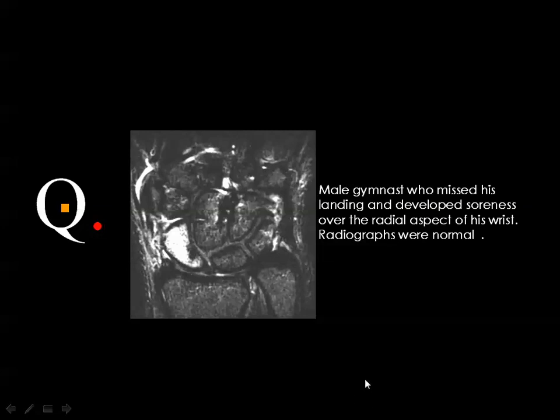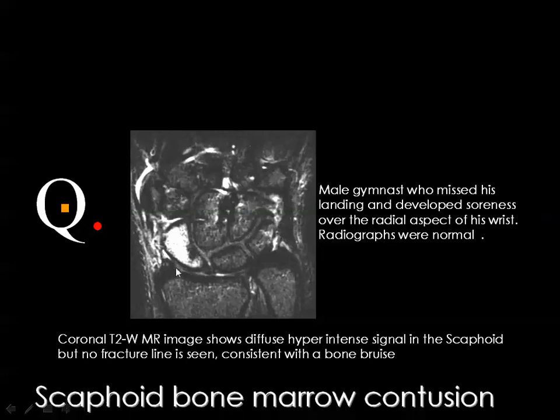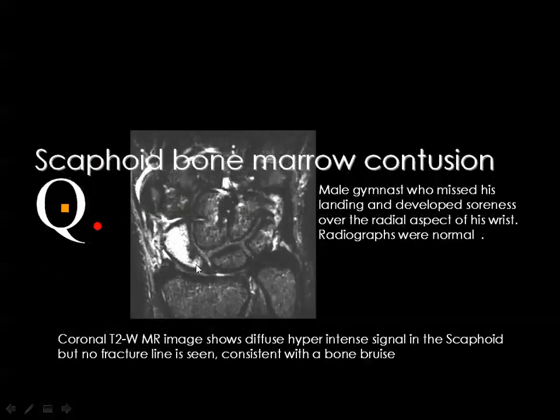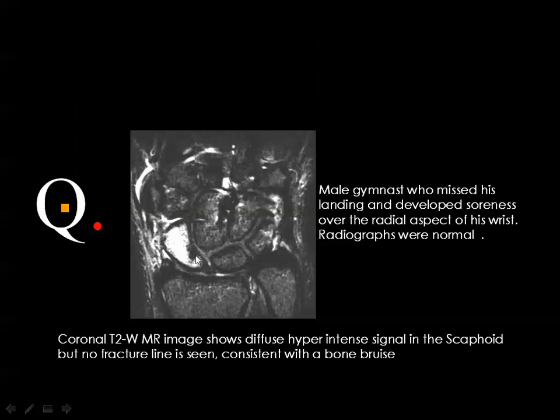You get bone marrow edema of the bone without evident fractures. Of course, here there is no avascular necrosis, which happens in the proximal bone, but this area is not edematous, while the rest is all diffuse bone marrow edema, post traumatic.